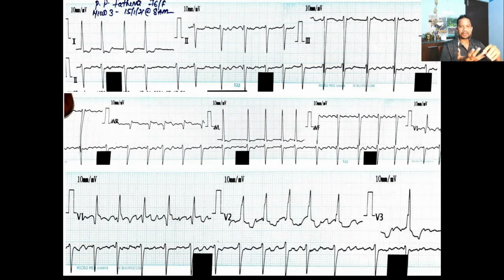So common causes of LAD are left bundle branch block, in which the QRS has to be broad. It is not that. LAHB, left anterior hemiblock: there you will get deep S in 2 and 3 and axis deviation of more than minus 30 degrees. Okay, and QRS is narrow, less than 3 small squares. Deep S in 2 and 3. So this is left anterior hemiblock. So this is a third finding.